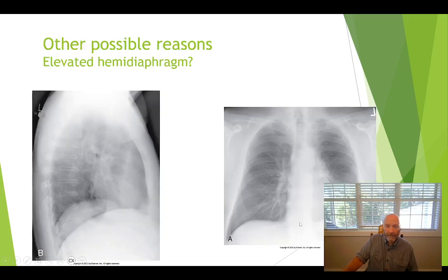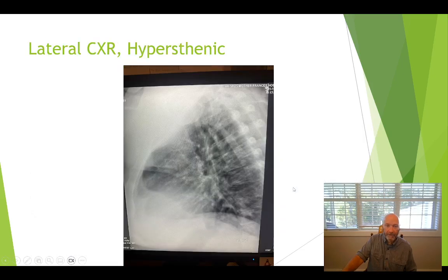So if you've got a patient, again, look at the PA. In this case, with this patient, what we have is the left hemidiaphragm is elevated. Why is it elevated? I don't know. It could be maybe the patient's got a phrenic nerve issue, or it could be that the patient has some sort of obstruction or partial obstruction in the mainstem bronchus, maybe a cancer or something like that causing it.